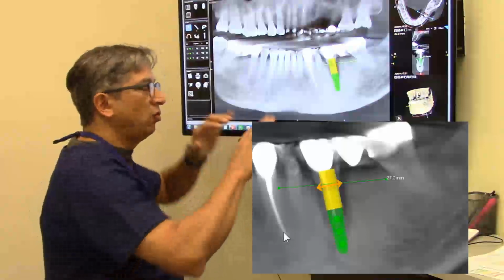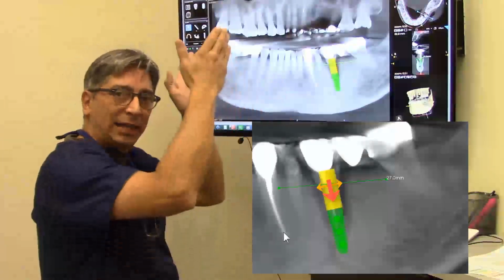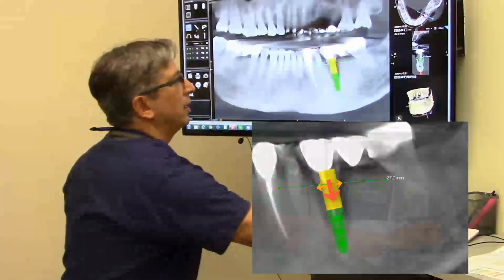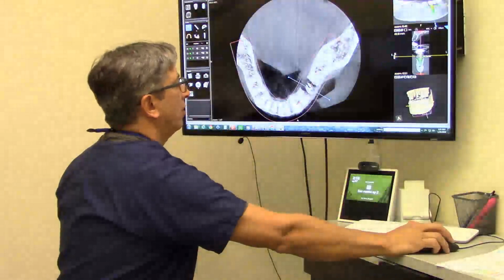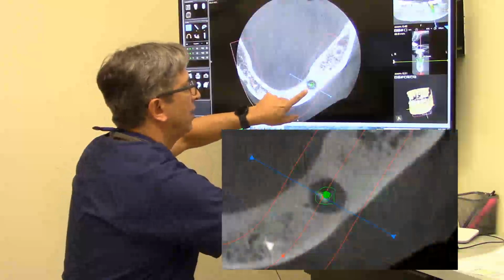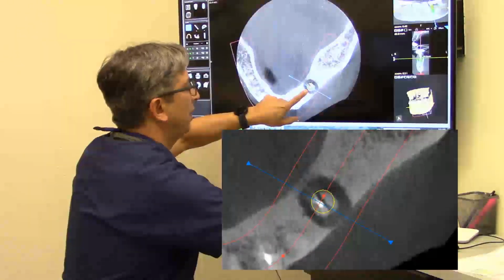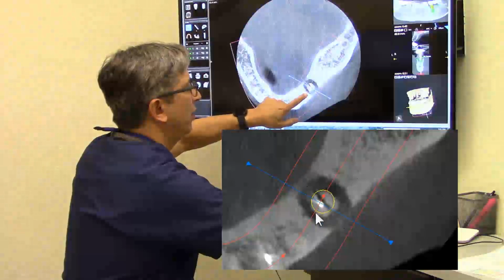I understand you do have bone on either side, but that defect is gigantic going straight down, and it's fairly wide. Let's look at this view. I'm going all the way down to the base where the implant is. That's the top of the implant here. Look how big that hole is. And when I get to the top of the implant, I'm missing a ton of wall over here and here. I only have wall from here to here.